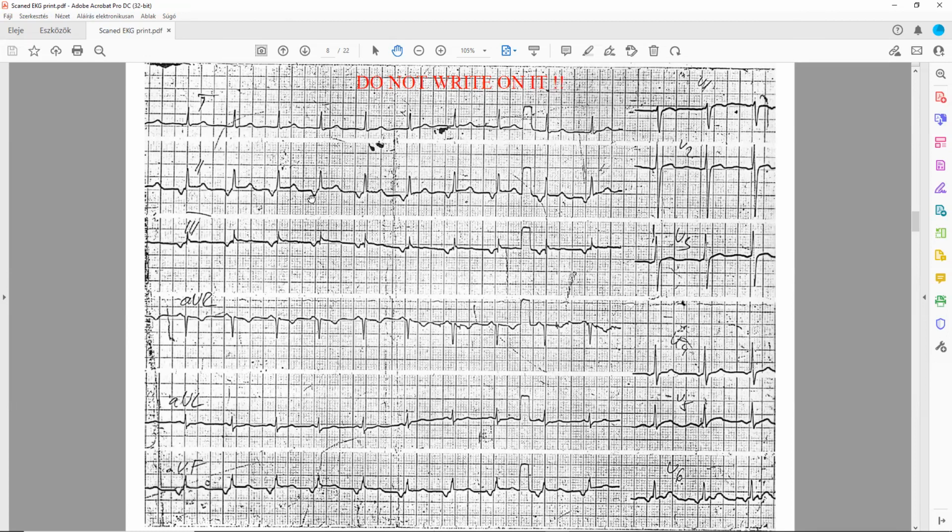It's junctional. Yes, that's great. That's a junctional rhythm, a junctional escape rhythm. Very good. So what is the problem with this junctional escape rhythm?